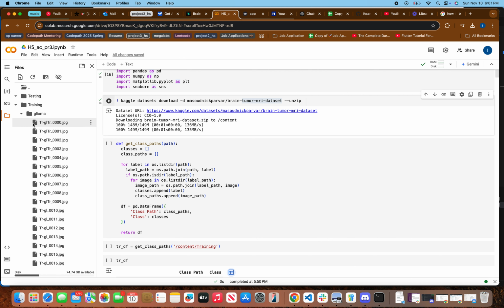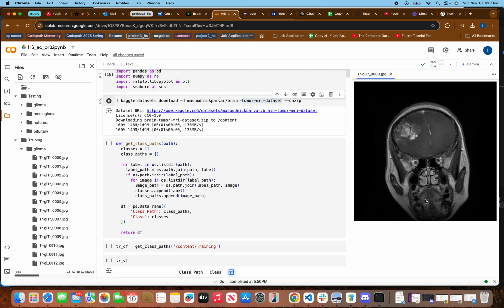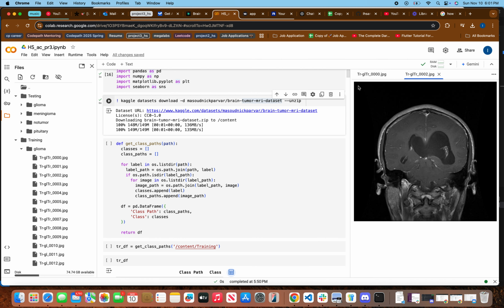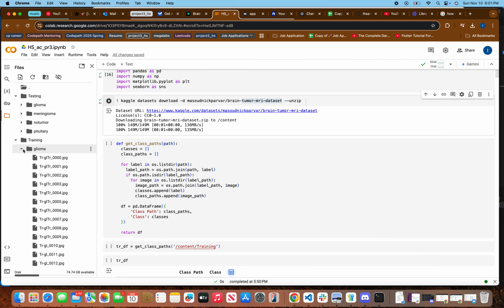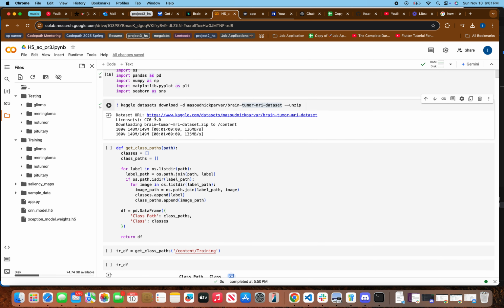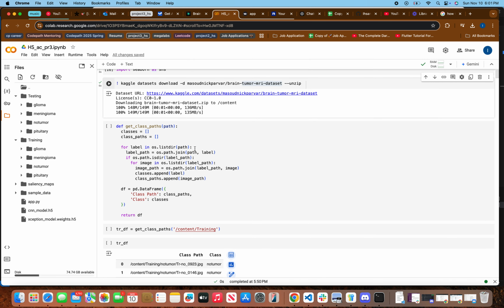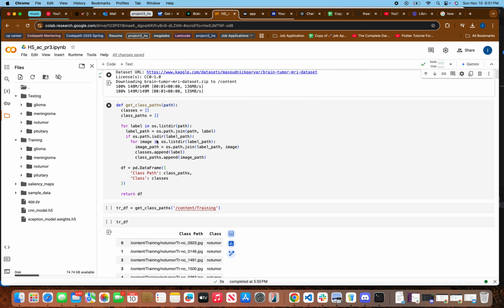You can see from my screen that we have already classified images of the tumor, and with what type of tumor, consisting of images classified as well. We first get the necessary libraries and then we download it directly from Kaggle.